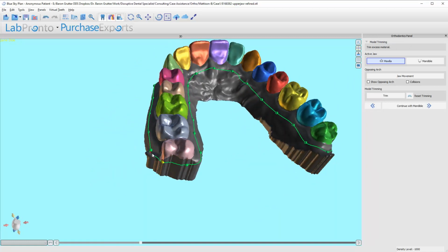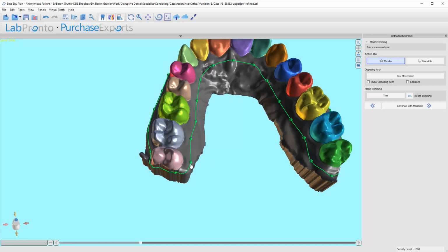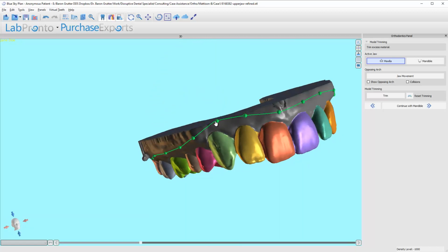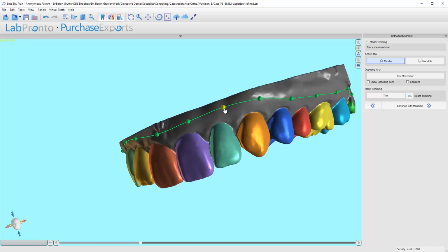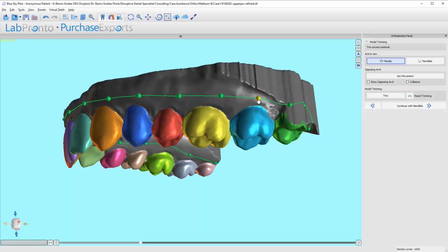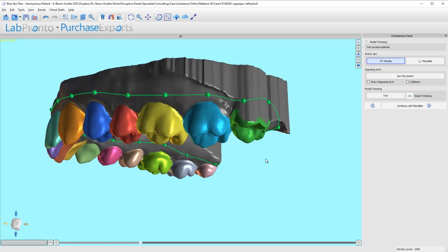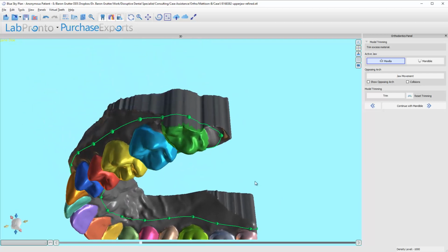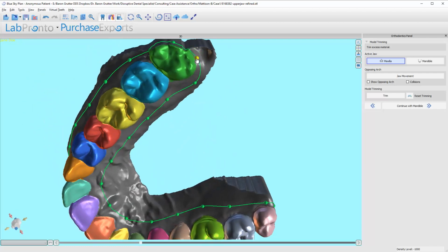All right, so I'm going to bring these lines up here a little bit, get them a nice smooth surface. Everywhere's pretty good. I'm more or less bringing it to the point where I would trim my aligner trays or just below that. Anything below where you're going to have your aligner trays just doesn't matter. So that's just my kind of thought process or how I think about that.